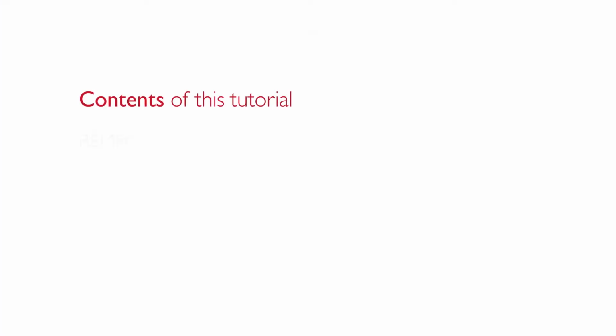Today we will introduce a new feature which is available in OasisNXT 2019.2 and later versions. We would like to show you how you can automatically and manually fit your client's hearing instruments to the prescribed target by performing a REMFit in OasisNXT with speech mapping.